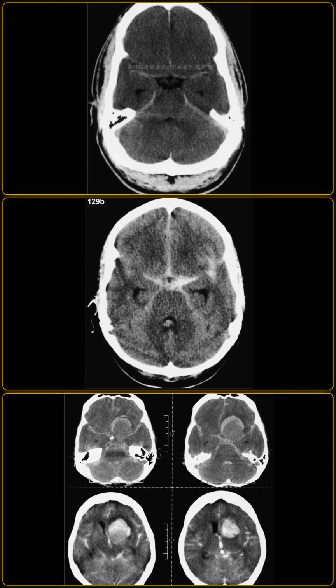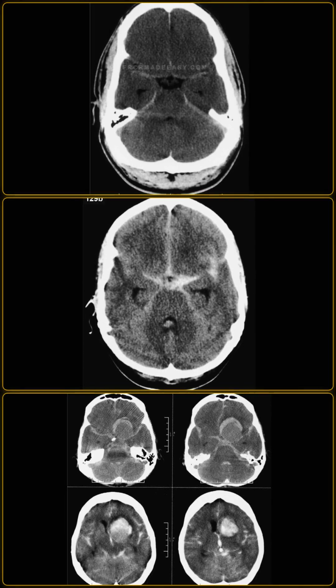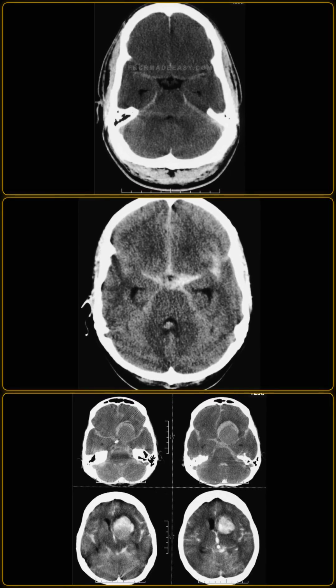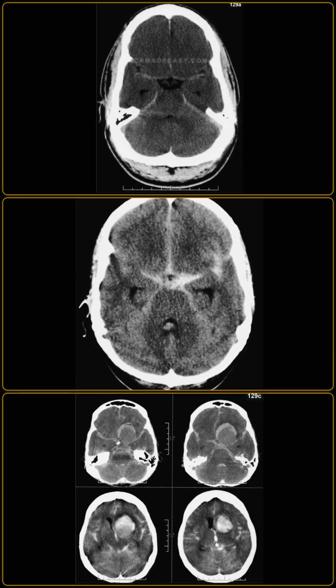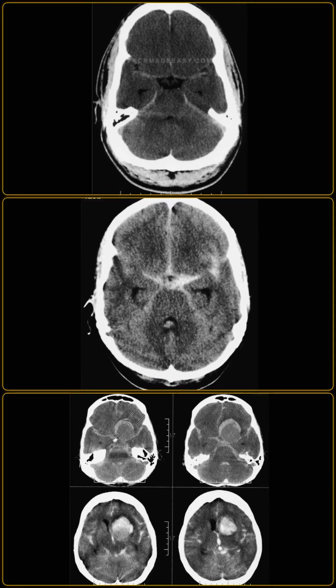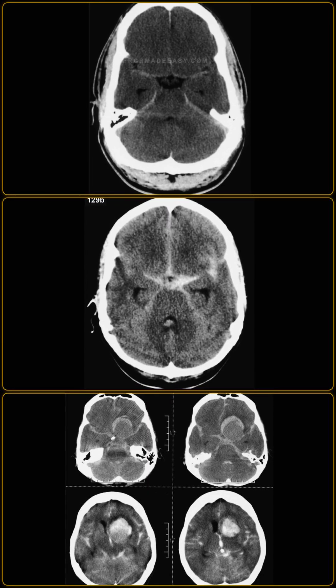As a radiologist, I would recommend immediate clinical correlation, checking pupils and brainstem reflexes, and supportive intensive care management for the cerebral edema. I would also recommend obtaining a brain MRI with diffusion-weighted imaging and MR spectroscopy in the subacute phase to assess the prognosis and extent of cortical necrosis.